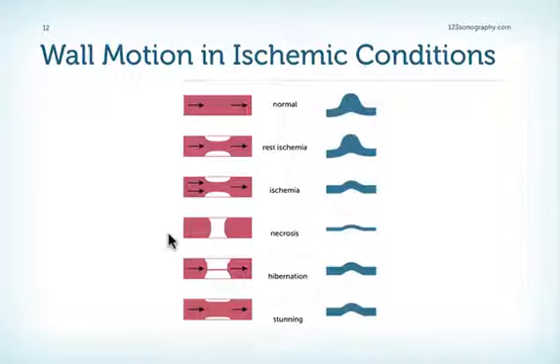If the patient had an infarct, there is an occlusion, then there is akinesis and the wall is thin. If there's an occlusion which occurred slowly or there's some form of collateral flow, then there is hibernation. In other words, the patient did not have an infarct. The segment is still adequate with respect to its thickness, but hypokinetic. And very similar, if the patient had an infarct and the vessel was reopened, there is stunning. We also have a normal thickness of the myocardium and hypokinesis.